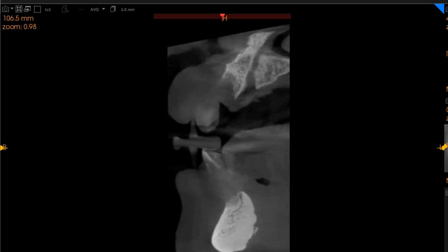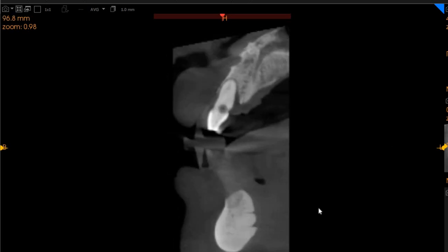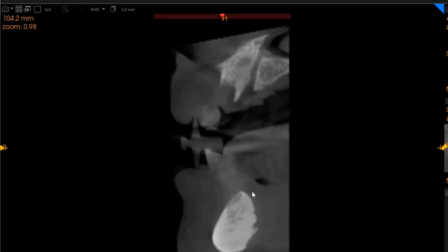Now moving to the lower anterior segment. In the lower anterior segment, we can show you that there are two areas where implants can be placed. So here you can see we've got D1 quality of bone, very thick cortical bone, very minimal cancellous area. We've got 9 millimeters of ridge width with approximately 10 millimeters of ridge height, and in the second incisor region we've got approximately 5 millimeters of ridge width with approximately 10 millimeters of ridge height.